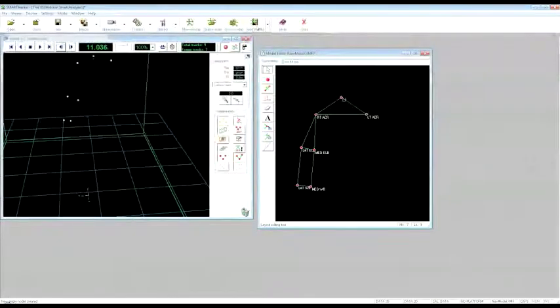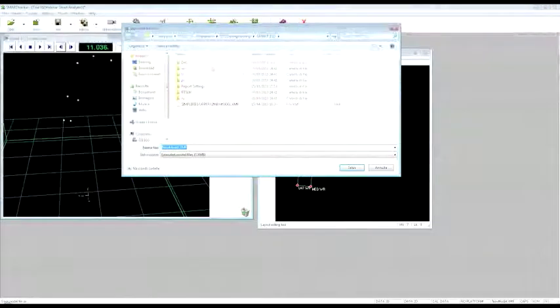To do that, we can click on Save Model, and in this way we will have our model available in our database, so that we can reuse it again in the future. So I'm going to save the model. You have to type the desired name, so sample model.